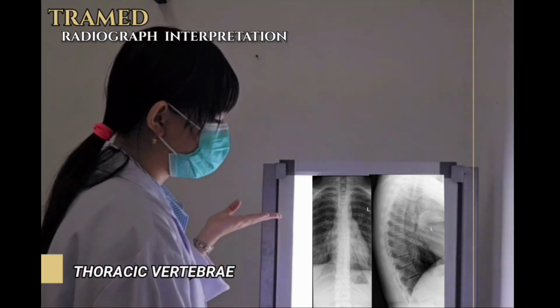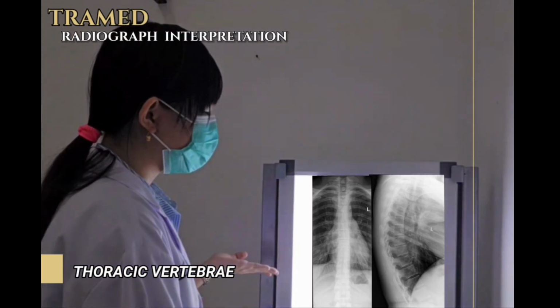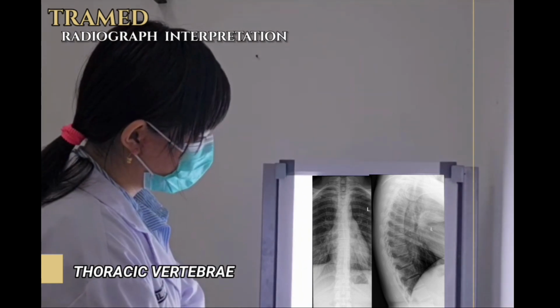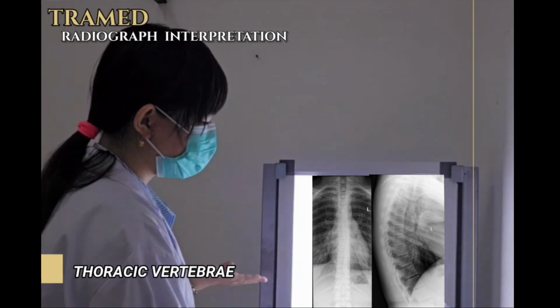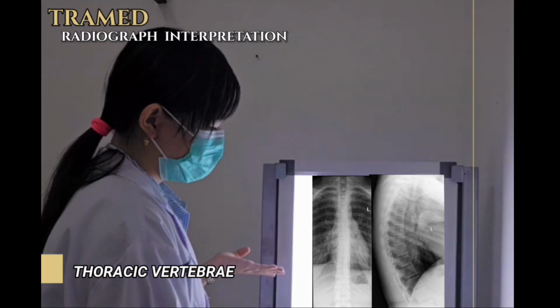For the next, we must check the thoracic vertebrae. First, we must evaluate the image adequacy of the thoracic from the AP. From the AP, it's normal, with adequate penetration, the intervertebral joint clearly visualized, and also the spinous process equidistant from the sternoclavicular joint. So it's normal.